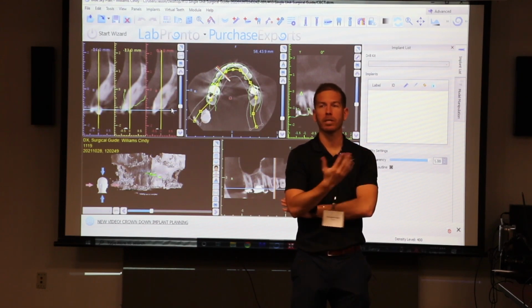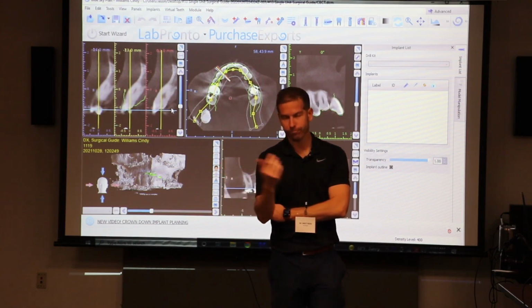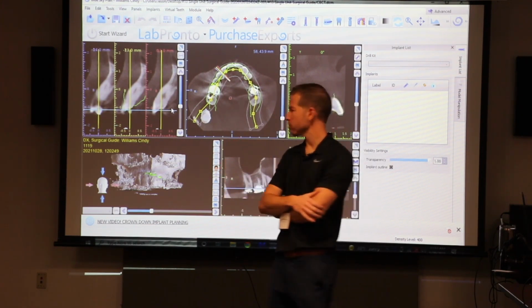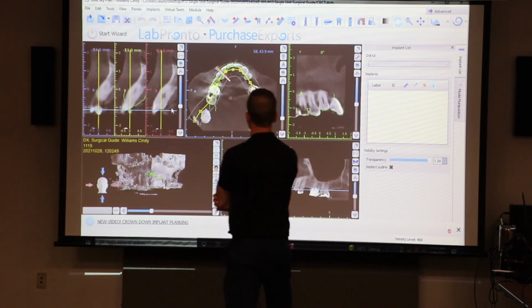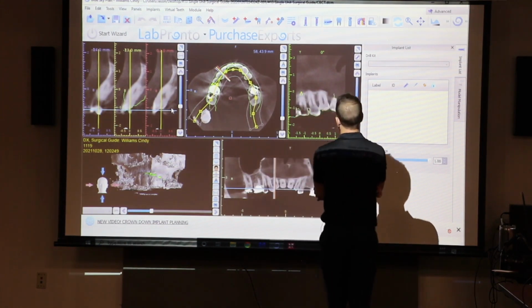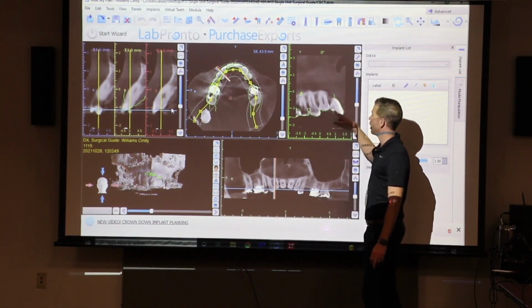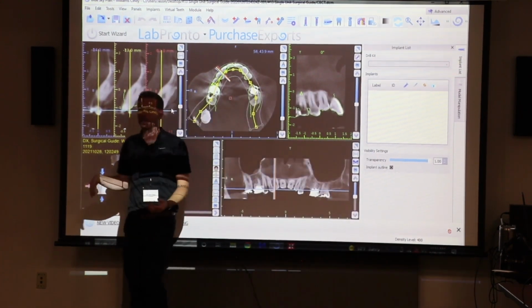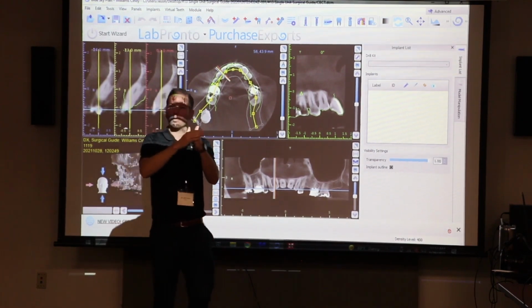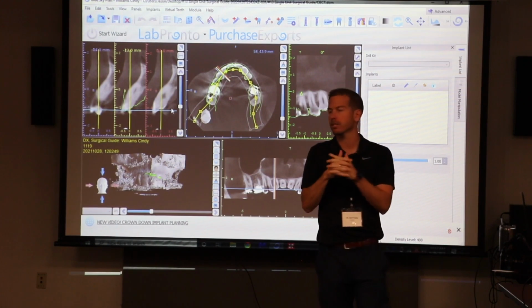You can see how it doesn't really require you to do anything. You just have to verify it. And we talked about scatter being problematic. So green outlines are that STL. So anytime you see that green outline, that's an outline of your STL, and you see that, okay, it's well adapted to that cone beam. So I'm confirmed that those things are aligned properly.